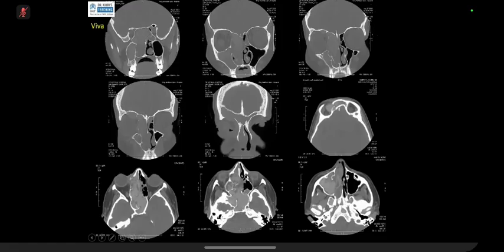On this coronal reformatted CT, considering the extent of the pattern extending from the maxillary sinus, okay, so this is an aggressive condition, could be a fungal sinusitis, since it's hyperdense with bony destruction. And why did you say that it is fungal sinusitis? Because of the hyperdense nature and aggressive bony destruction.